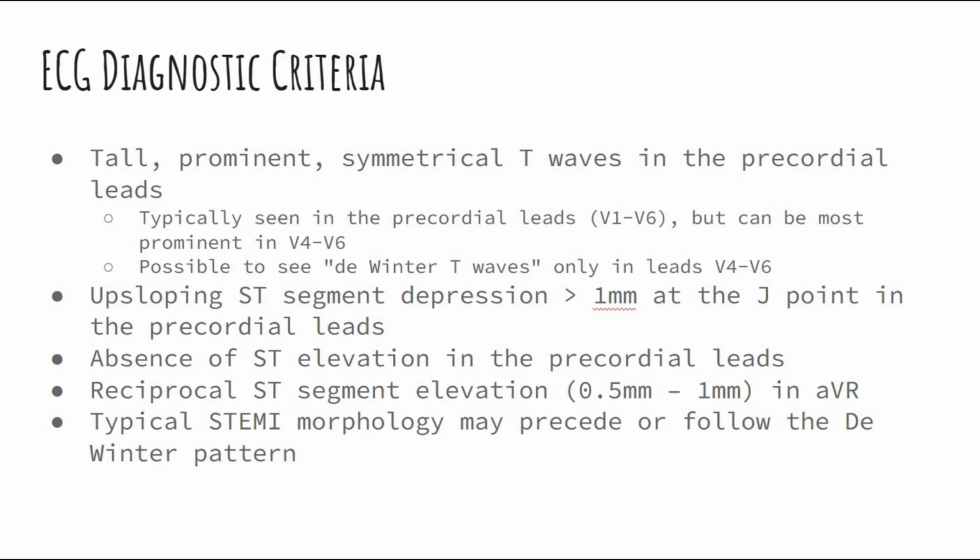You might spot a reciprocal ST segment elevation, typically subtle, about 0.5 to 1 mm in lead aVR. Interestingly, this pattern can appear before or after typical STEMI morphology.